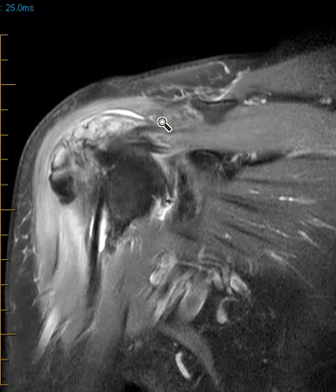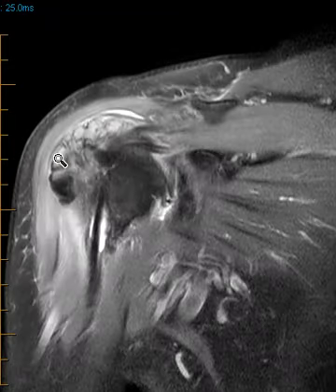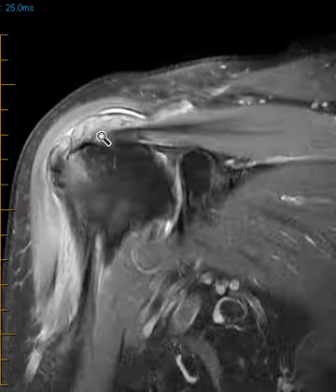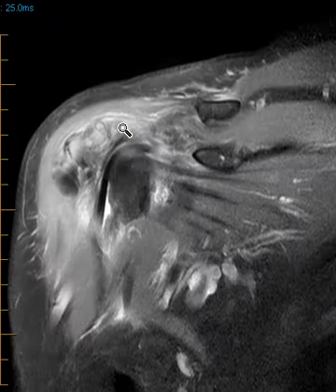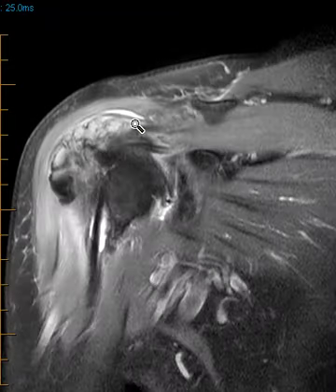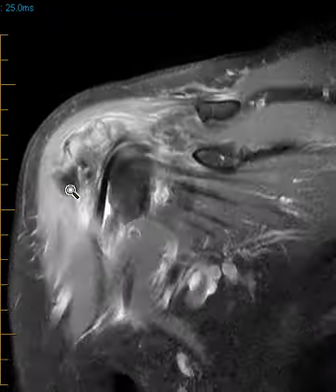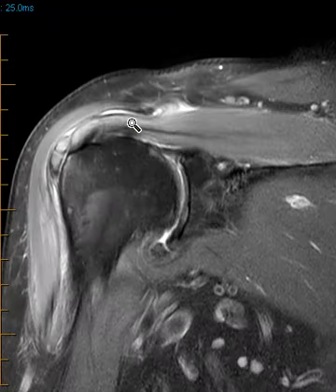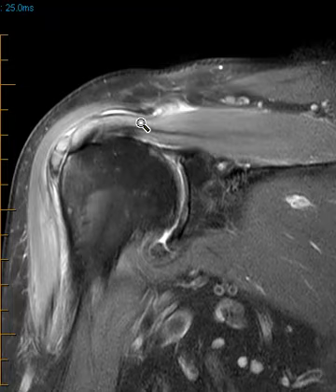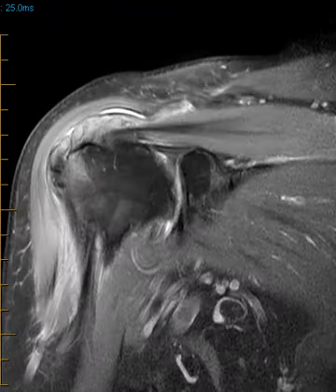So it looks like a calcific tendino-bursitis, one of the more advanced cases I've ever seen, where instead of having a nice simple little fluid collection over the top, or a really uniform inflamed bursa, we have this loculated, really bizarre looking bursa. And you can see that there is low signal here, so we want to look on the x-rays to see is there calcification in there, and if there is, then it'll be a simple case of calcific tendino-bursitis with just this unusual inflammation.